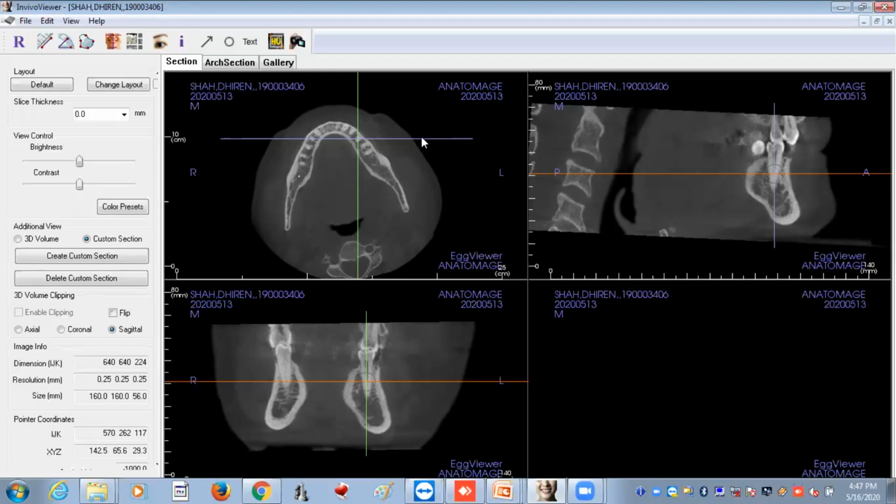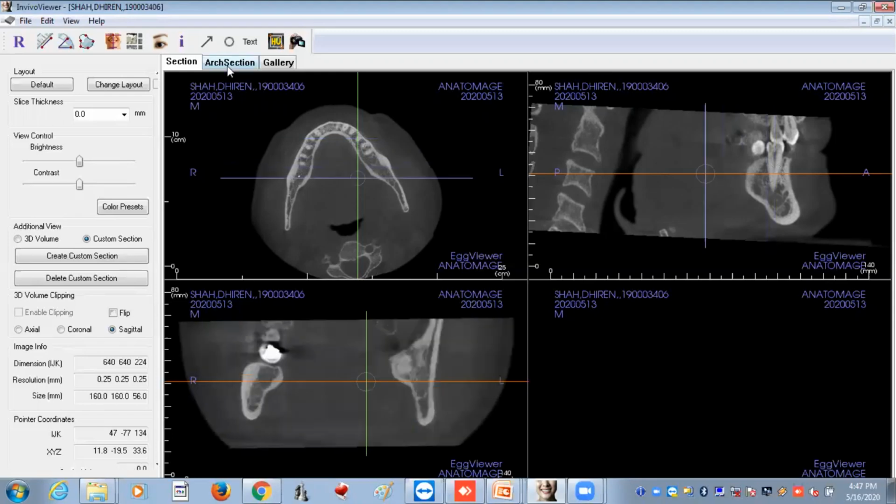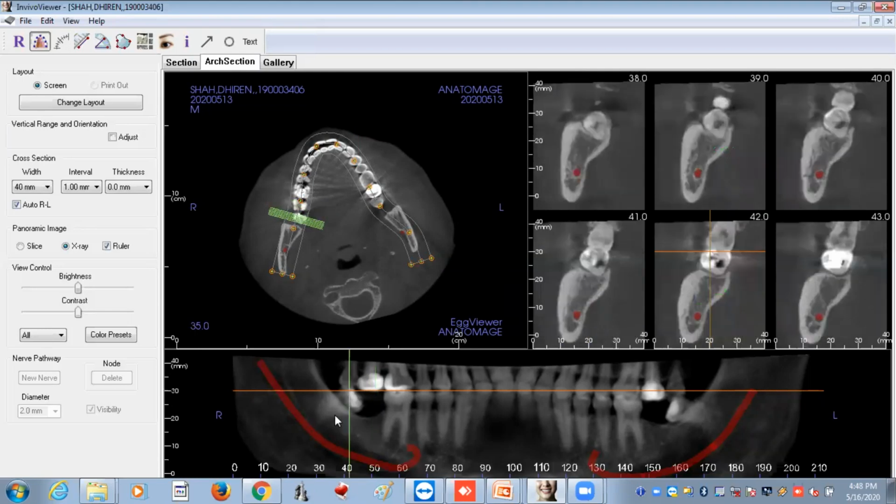Now I would like to check this. So now CBCT software is also useful for evaluation of impacted teeth, as we have discussed. Now in this section you can see there are two impacted molars. So now we can see the distance of the impacted third molar root from the inferior alveolar canal, that can be easily measured. So I am just moving my cursor onto the root area.